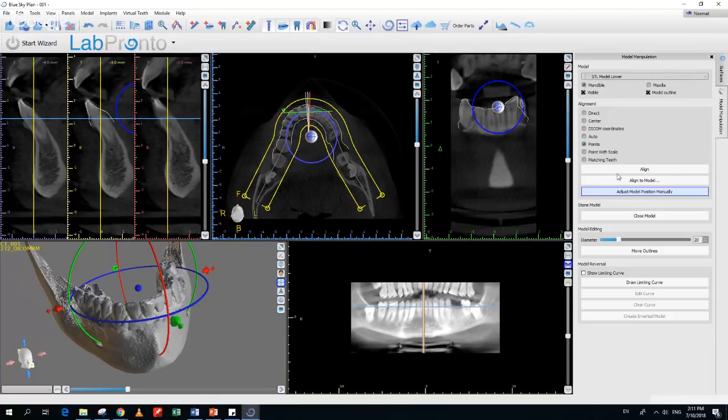There are other import functionalities that, if we have time, we're going to demonstrate later on, but just in a sentence or two, if you have one model already merged, but you had another model that was an occlusion from a scanner, then once you merged one model, you could import the second model and it will be aligned to the first model automatically. That's based on the align to model button we have.